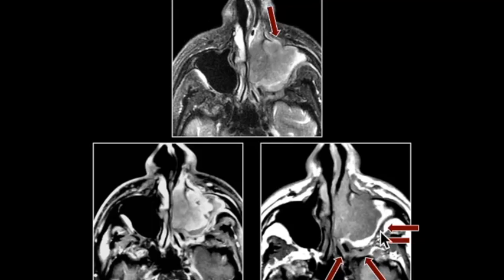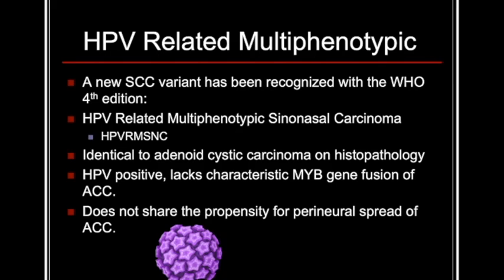So this is perineural spread of the tumor along the posterior superior alveolar nerves, which help supply the maxillary molars and the maxillary premolars, which is a good explanation for why we have a little bit of tumor sitting there in the alveolar recess.